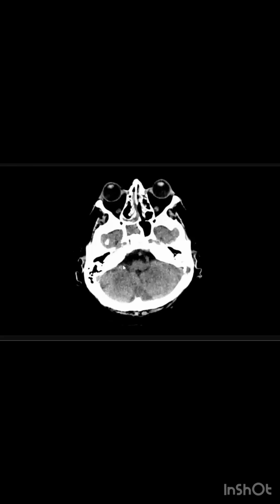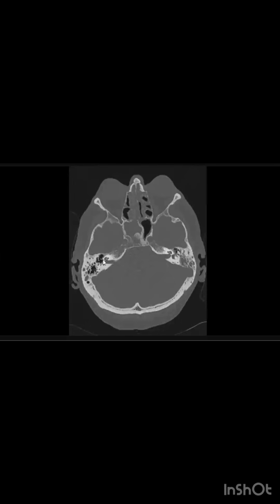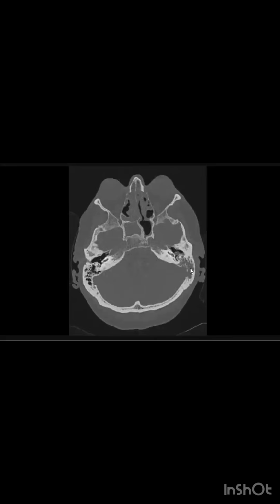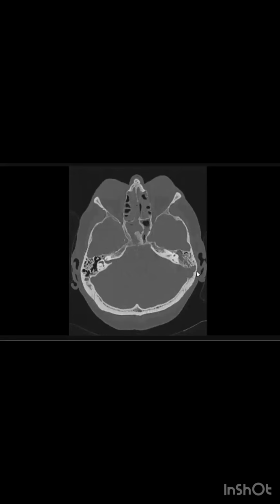If you found abnormality in the mastoid air cells on the soft tissue window like here, and you found a collection, you have to go directly for the bone window. You took more time to ask for the bone window, and you asked for it post contrast first. On the bone window, there is opacification and erosion of the mastoid air cells and middle ear cavity. You have to comment on the middle ear, the malleus and incus. On the other side, some opacification but no erosion.